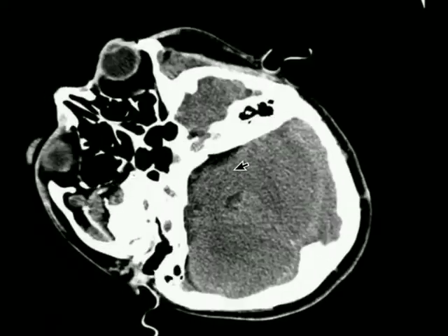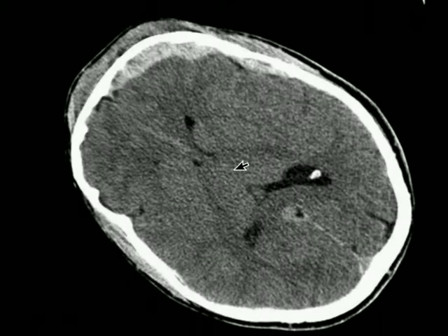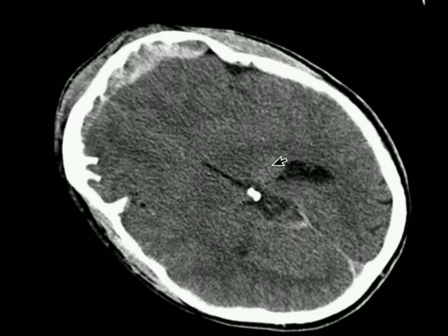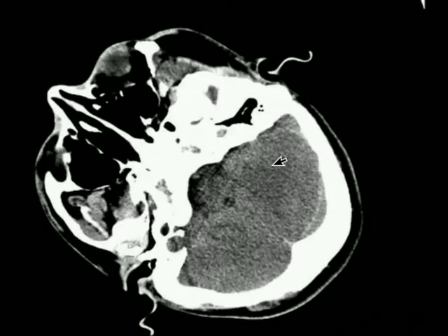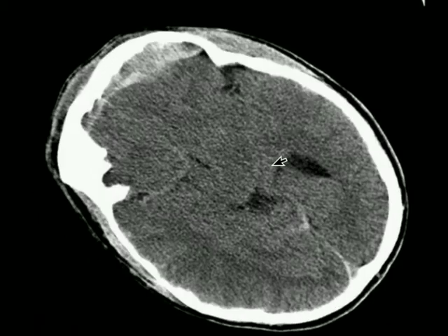Other important aspects to note when looking at CT heads after a brain injury is whether there's any skull fracture. So there's a separate bone window that we can look at specifically for this, and also looking for signs of compression of the brain. So if there's any shift of the midline, so this line here might be slightly pushed over here if there's any compression, and also looking for cerebral herniation, which is a life-threatening sign. So important to pick up.